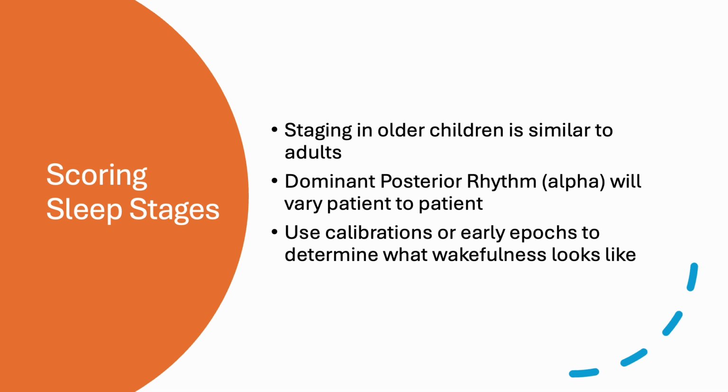The PDR will vary from patient to patient, from age to age, and it can be difficult to determine, but if you get a good signal recording of the biocalibrations, then you should be able to see PDR with their eyes closed. PDR usually shows up best just before the patient falls asleep because kids usually don't close their eyes until they're just about to have sleep onset, and they're much more relaxed than when the study was begun.